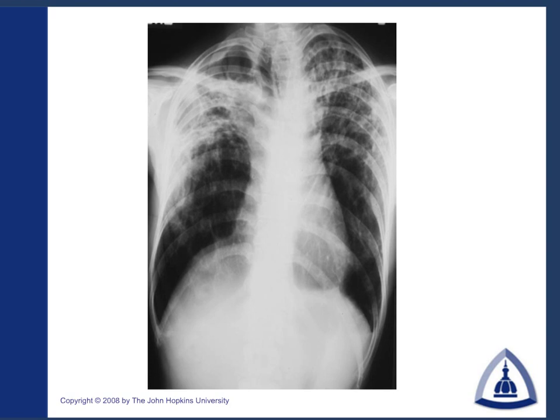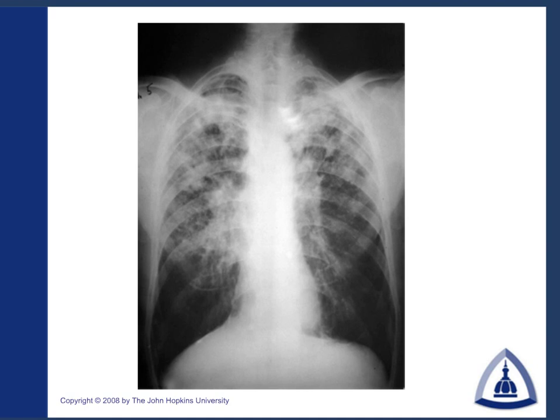This just happens to be fibrocystic sarcoid. As opposed to this patient here, who again, bilateral upper lobe infiltrates, bronchiectasis, cystic spaces here. This happens to be a patient with cystic fibrosis. You'll get that from the history, but if you look at the chest X-ray and use the mnemonic, it will help you out.